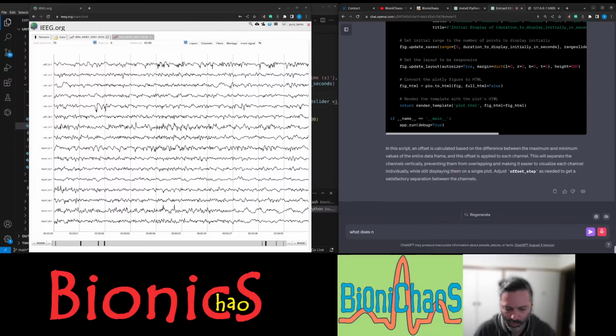Why doesn't the window scale vertically? It's only a narrow box in the middle of the browser.